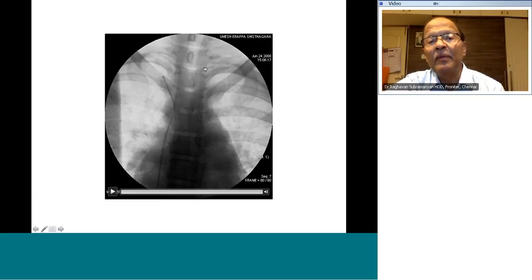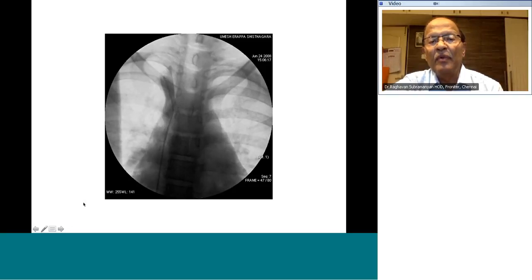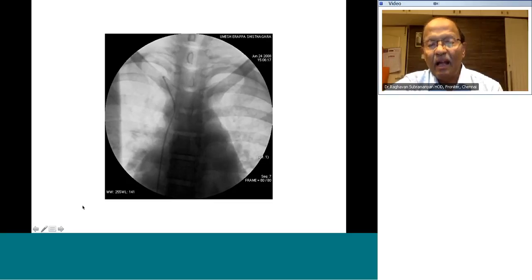One oval shadow here and one oval there. If you see the two pedicles completely end on, at an equal distance from each other, you know that the spine is straight, looking at you, and therefore this must be a straight frontal projection. Whenever you do an oblique, these two pedicles will not be seen end on. So this is the typical frontal view of a frontal angiogram, and most of them would be anteroposterior views.